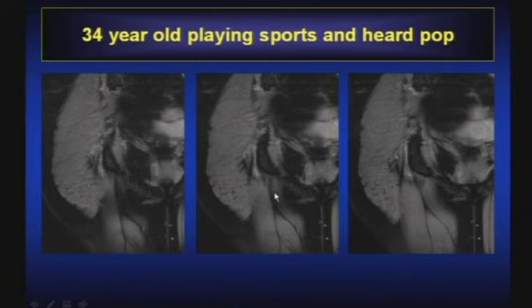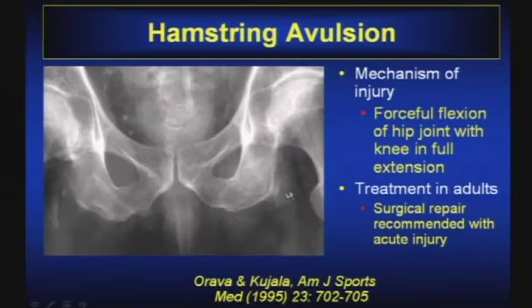But you need to follow it down to be sure that you're really in the hamstring and you're not in the adductor, okay? So it's going to be medial, just adjacent to it and slightly anterior. Okay, so follow on sequential cuts and also follow on the second plane of verification, which could be your axial imaging plane.